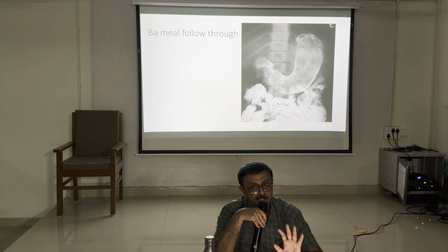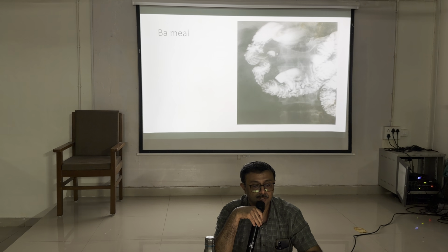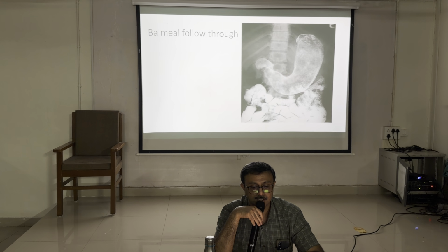Yes, endoscopy can identify it, but the best is CT scan or barium meal. So here you can see the duodenal cap, just after entering, the first part of the duodenum. That is called the duodenal cap, and that is also a normal sign.